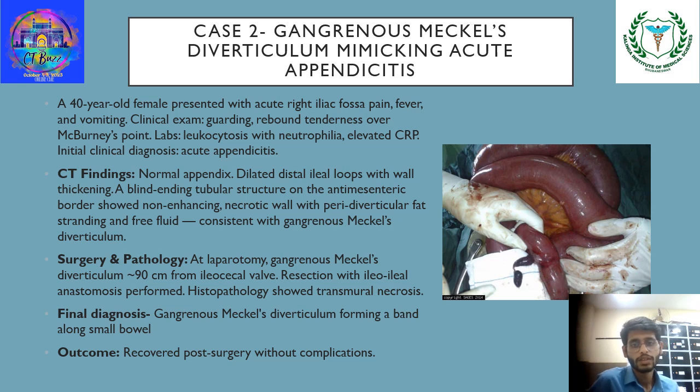Case 2. This is a case of gangrenous Meckel's diverticulum mimicking acute appendicitis. A 40-year-old female presented with acute right iliac fossa pain, fever and vomiting. Clinical exam showed guarding, rebound tenderness over McBurney's point. Lab showed leukocytosis with neutrophilia, elevated CRP. Initial clinical diagnosis was acute appendicitis.